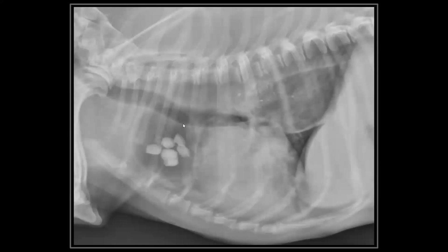So this is most likely some sort of megaesophagus and maybe even an esophageal diverticulum, or it could be a redundant esophagus. I know that specific finding doesn't really have anything to do with what we're talking about. However, there is still a cranioventral pattern here. There's an alveolar pattern superimposed with the dorsal aspect of the cardiac silhouette. And again, SignalPET would recognize this as an abnormal cranioventral pattern, or CVP.